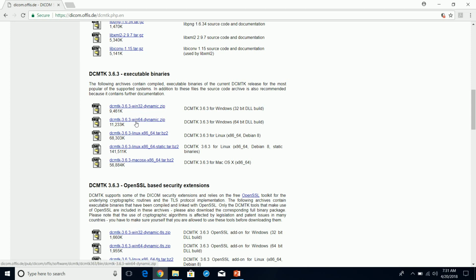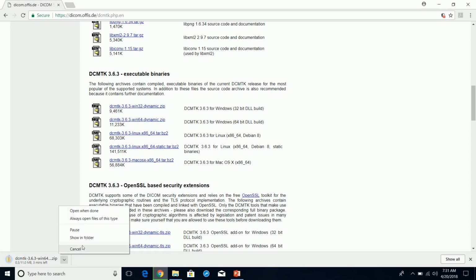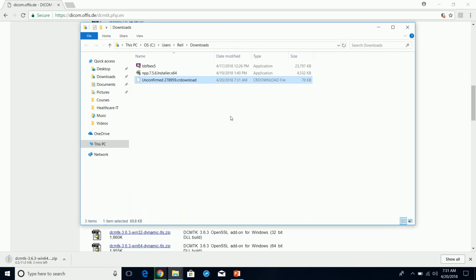For us, we're going to want the Windows 64-bit. I'll just pause the video and wait until it finishes downloading. All right, downloading is complete.